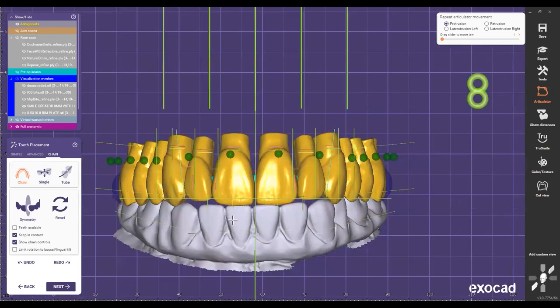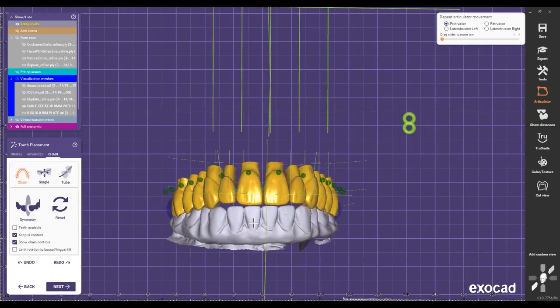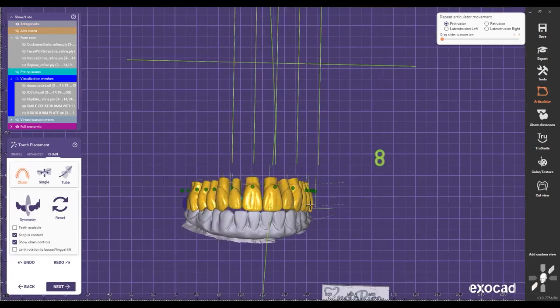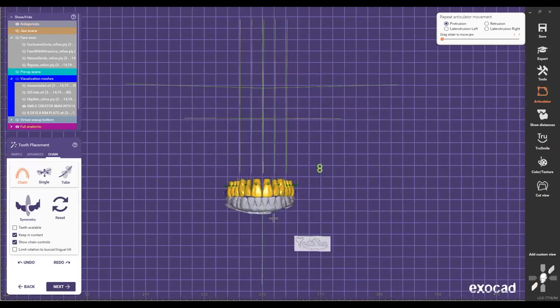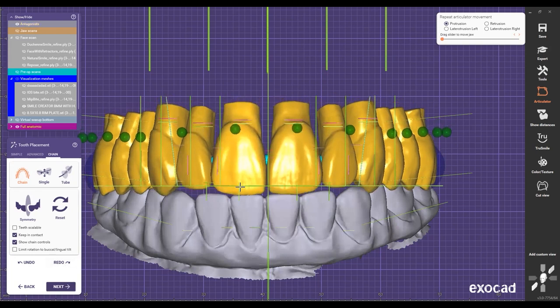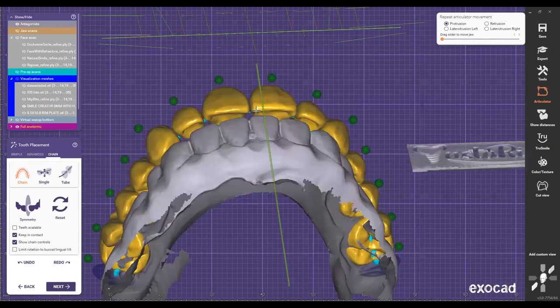So, and then later, once we do both, I can tell the doctor, hey doc, I have two options here. I can leave my design option ideal, like where it is right now, right here, right? Leave it there, and the patient's gonna have that space there. And then we can tell the patient, okay, now we're just gonna fix the lower down for the next time. Or the other option is, I can just bring everything right here down, kind of like edge to edge. And I tell the patient, okay, you're still gonna have a space right there, but we're gonna fix it once we do the lower.